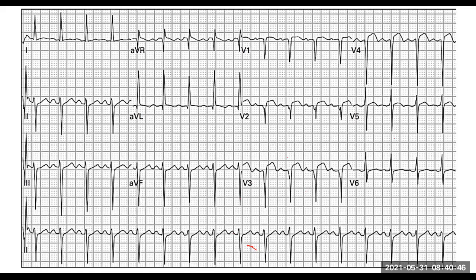However, it may not be a ventricular aneurysm. Let's say you do put it on, there's nothing to suggest an aneurysm, there's no bulge, nothing like that. Then you would come back to, okay, it could be pericarditis, which is an infective condition, or it could be myocardial infarction. Now, we know it's cardiac. So in other words, we've excluded things like pneumothorax, we've excluded things like an LRTI, we've excluded all of those things for now. All right.